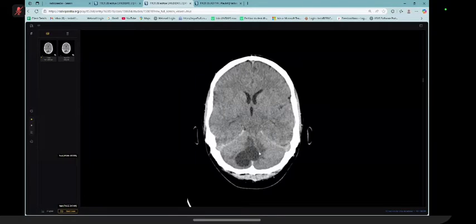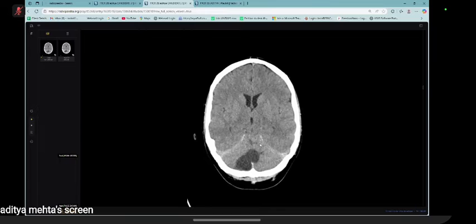My principal diagnosis in this case is likely an abscess, brain abscess, with developing hydrocephalus. As this is an emergency, I will pick up my phone and inform the referring physician. I will suggest a referral to the neurosurgical team for urgent management. That would be in the form of ventriculoperitoneal shunting.